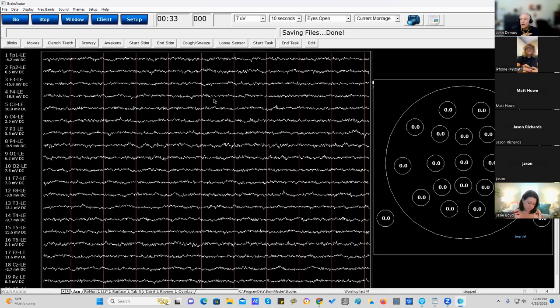So it's something to keep in mind. And in those 3 minutes, there must be at least 1 minute of quality data. Otherwise, you have to keep recording. All right, so what am I going to do? I'm going to close Avatar.